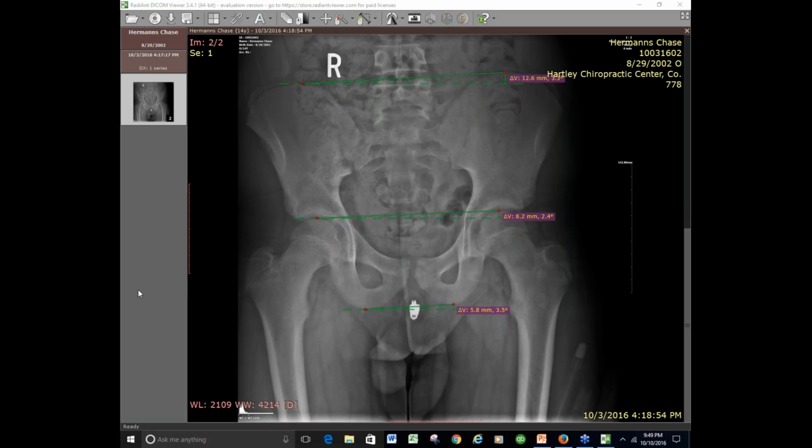I actually have two questions, but first one, when I look at the ischial foramen in this x-ray, it looks like, is there a flexion of the pelvis here? That looks to me more like inflare than it looks like flexion. Okay, let's see. We can check that real quick. That's not super hard to check. And again, like I said, I'm doing a rough estimate of this for speed.